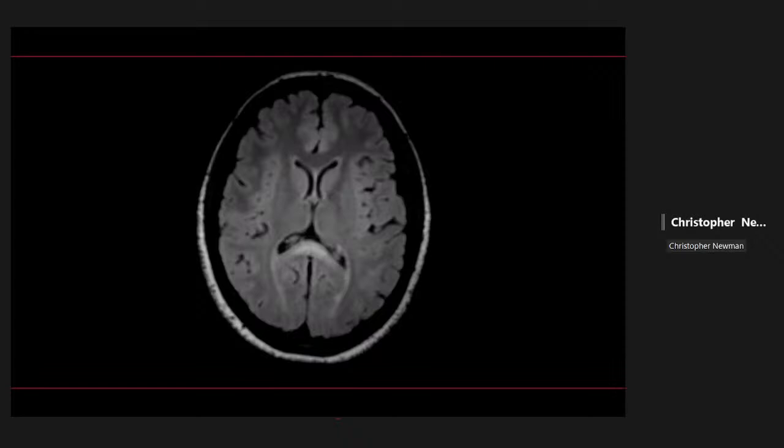So let's say this patient is a chronic epilepsy patient, and they had a study, say, a week ago that was totally normal, and then they came in with more seizures, and now we're seeing this study. I'm drawing a blank.